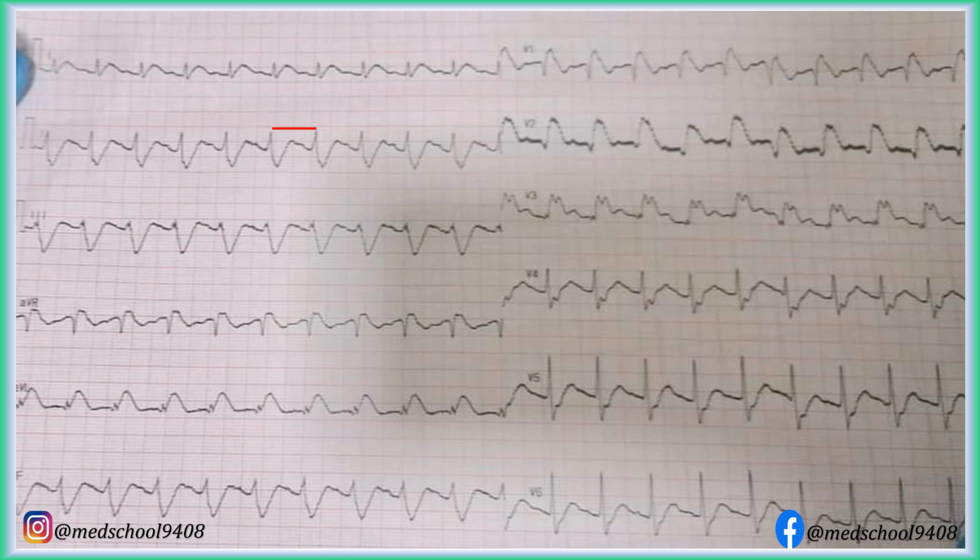There is RS or equiphasic QRS in lead V4. RS interval in precordial lead is less than 2 small boxes, so it is less than 100 milliseconds. There is no QR or QS pattern in lead V6.